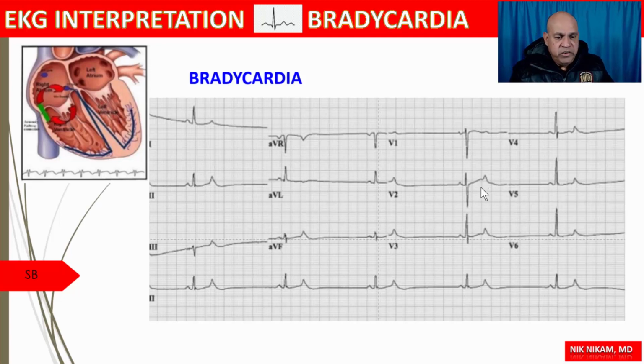So if this is a premature atrial contraction, then we are dealing with a sinus rhythm with blocked atrial premature contractions with a compensatory pause, resulting in what appears to be a bradycardia. That's how I want you to analyze the electrocardiograms, rather than jumping to conclusions by just looking at first glance.